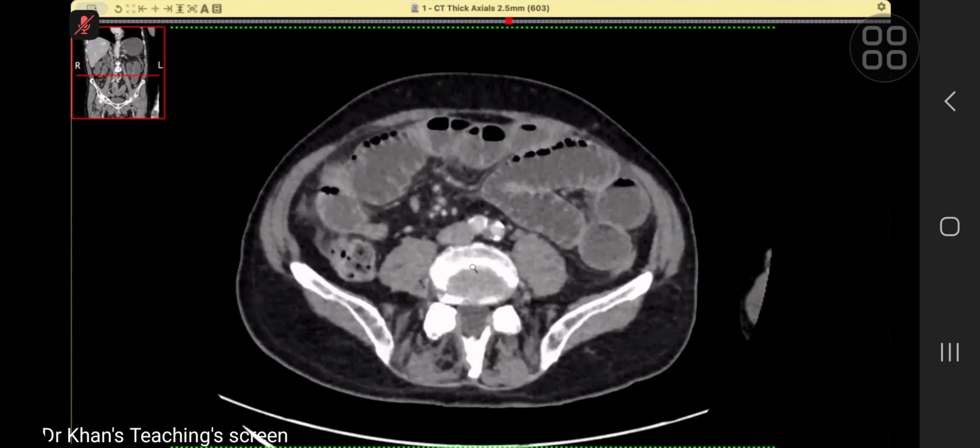So what do you think is happening? Give me your conclusion. Because of the additional lesions, it could be due to a metastatic process such as metastatic lymph node enlargement. In the case of circumferential thickening, most likely due to carcinoma of the small bowel. Unlikely, it could be due to lymphoma, although this is not typical. Okay, please, I'll take over. Thank you.